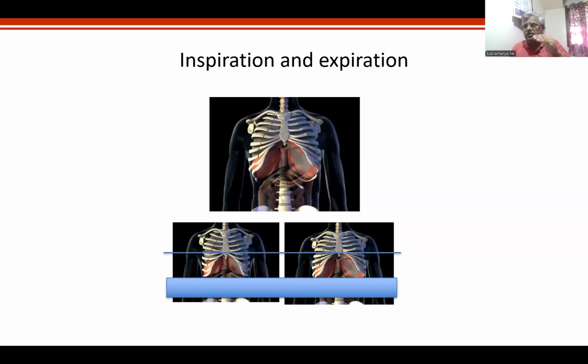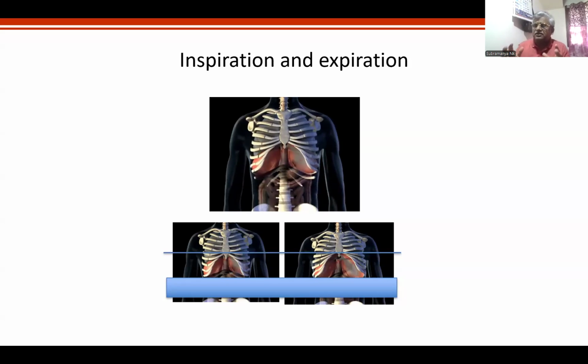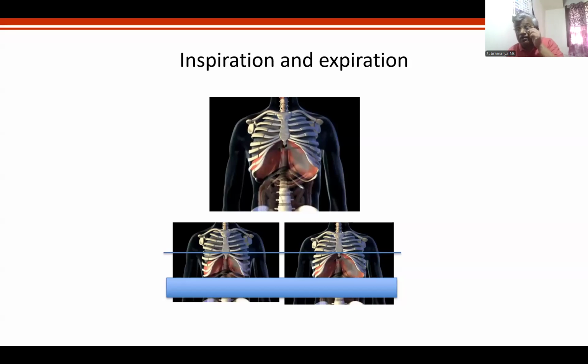If you think that, okay, the upper half is fine for me, the lower half, I have a doubt, I can't see, there is some diaphragm, there's something here, take a lateral. It clears. And CT scan is available in only a few places. But wherever an X-ray is available, you can also take a lateral. In the lateral, suppose your perfect lateral doesn't come, please do not worry. Don't worry about it because you already have an AP with you.